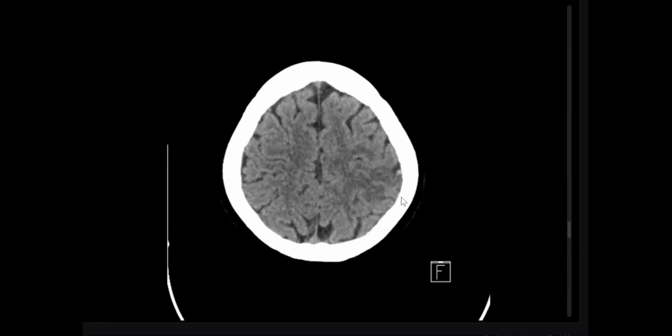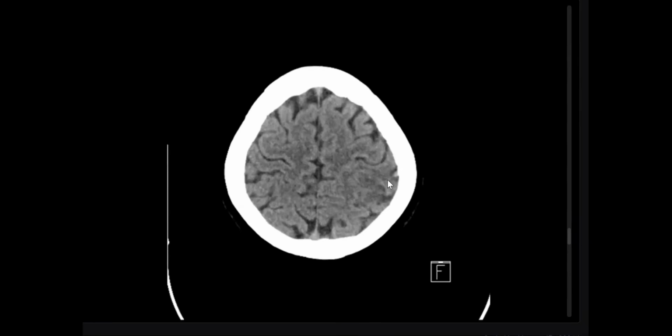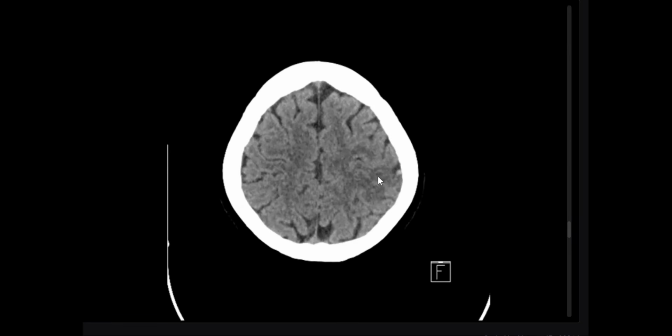You told me no hemorrhage, I agree, but no infarction? Are you sure? There's mild cortical hypodensity seen. You see here, by comparison, there is a hypodensity near the vertex that may reach the cortex. Is this an arterial territory? No, definitely not, so it follows the venous territory.